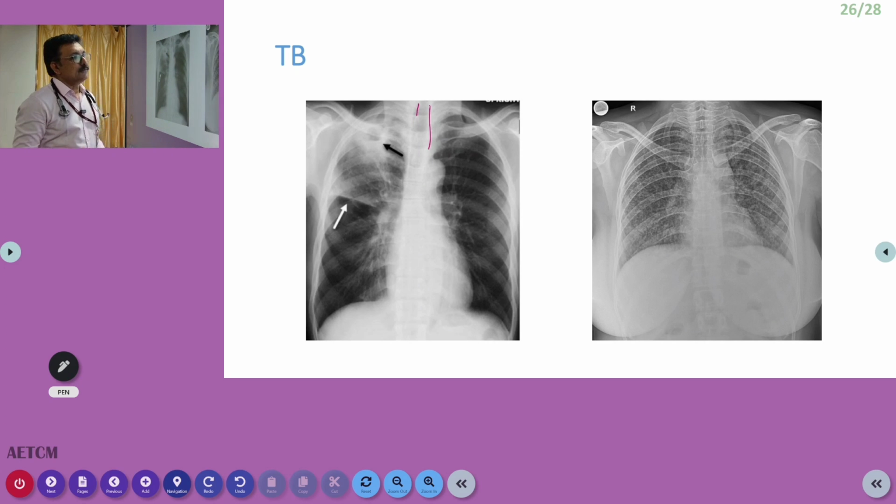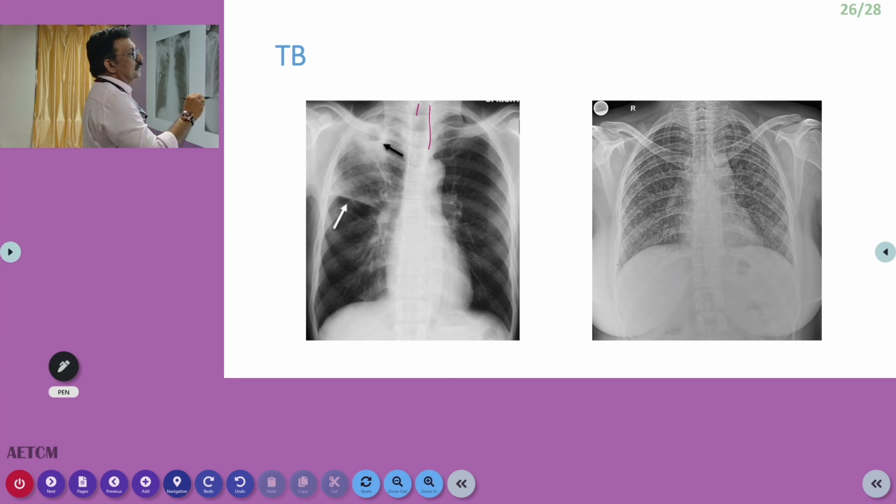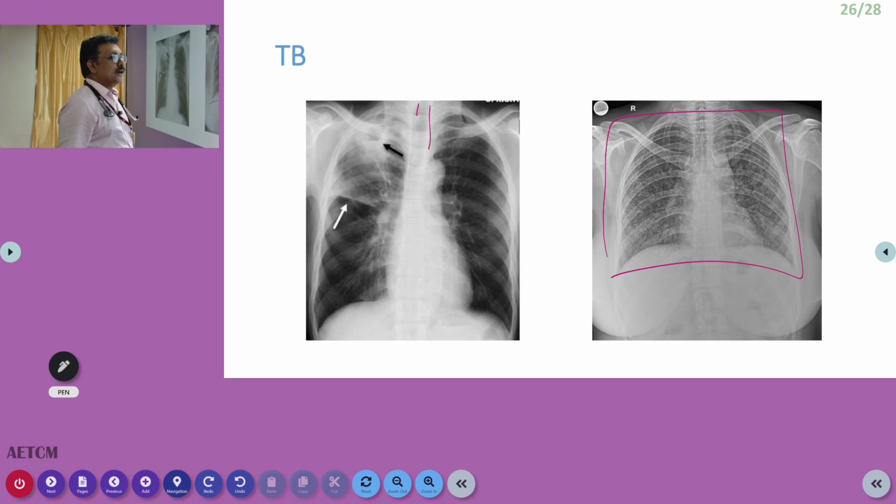But in tuberculosis, another presentation is miliary mottling, a small mottled appearance throughout the lung field; white patches you can see throughout the lung fields. So that indicates miliary mottling. But if the same type of lesion is seen in a patient coming with acute breathlessness since the last 2-3 days, then it can be viral pneumonia, bilateral pneumonia, bronchopneumonia because of viruses like H1N1, COVID and others. A patient who has HIV infection and comes with a very low CD4 count, this X-ray may indicate PCP pneumonia. So depending on the clinical scenario, here also the diagnosis may change.